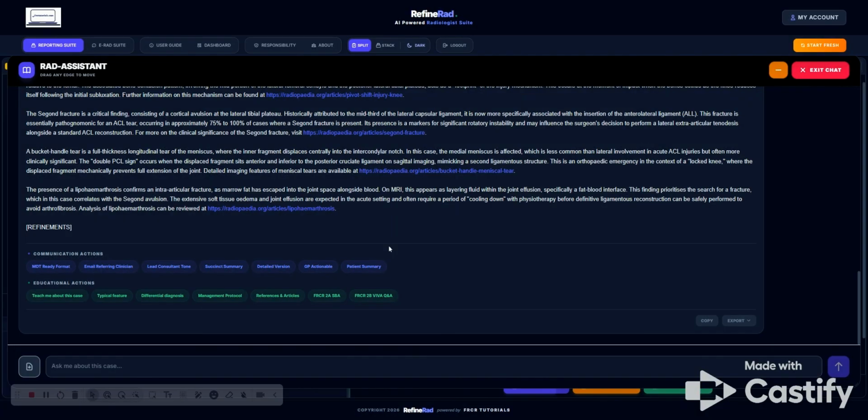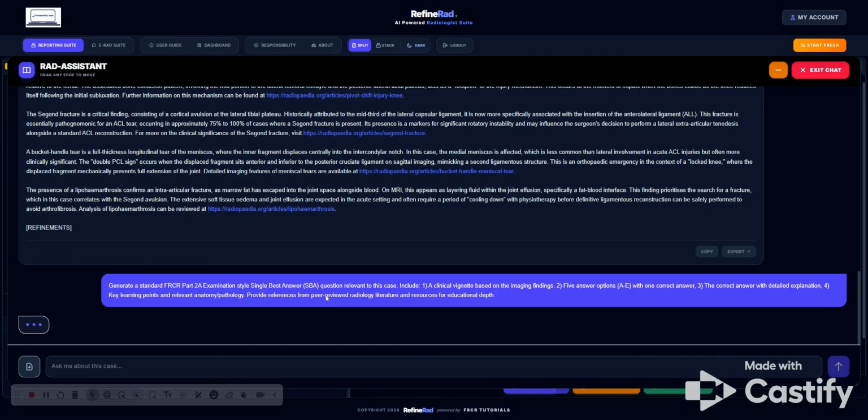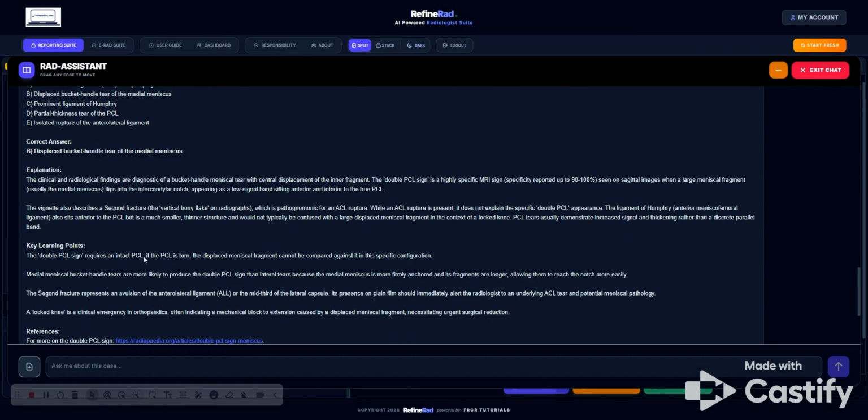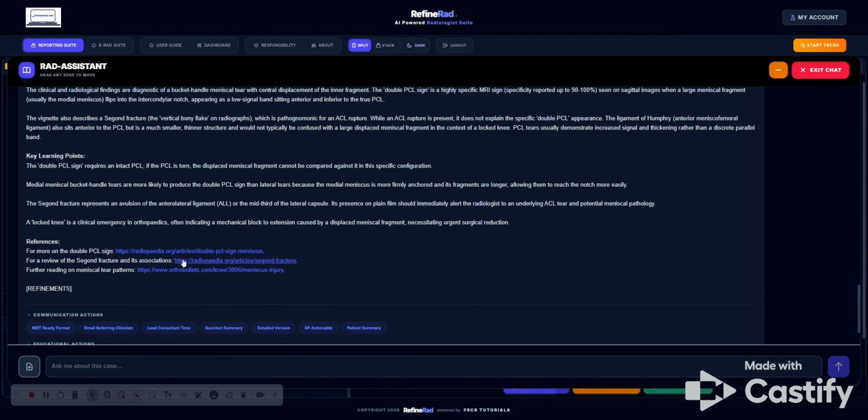If you are preparing for FRCR 2A and you want to know if there can be a single best answer question, you can generate a single best answer question and answer, as well as some reading material for the 2A preparation. So that's your SBA question, and then an explanation as to why B is the correct answer. And then there are some key learning points, and again lots of references.